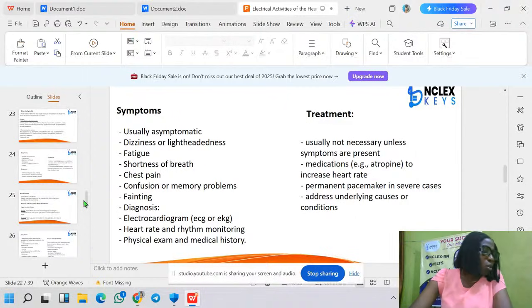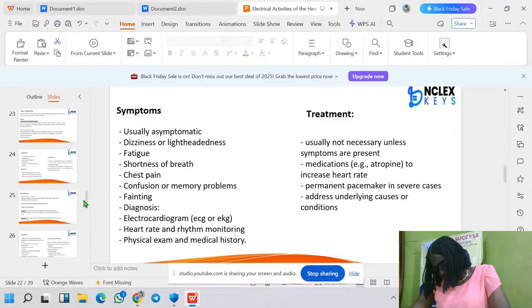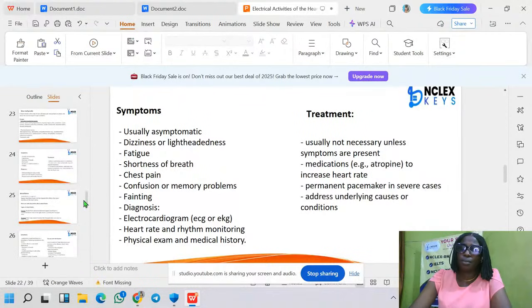No, I'm not asking you for the pulse. Please learn to do it sequentially so that you won't forget anything. I'm not asking you for the pulse of the patient. I'm asking whether this strip is a 6-second strip. Please confirm that.